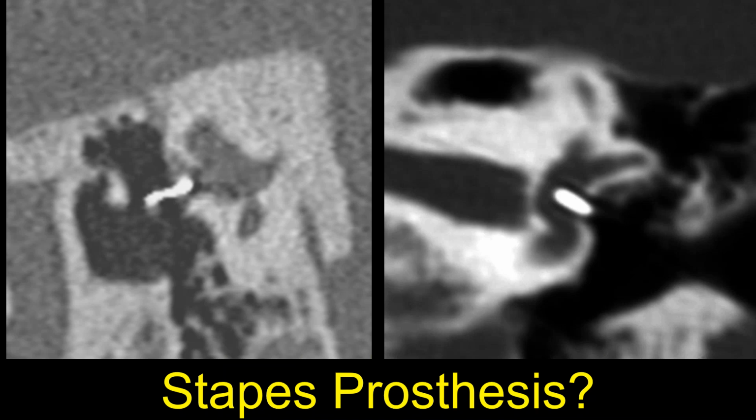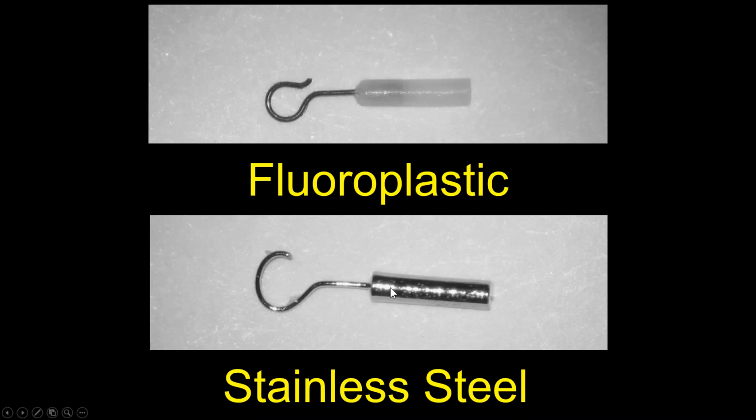So first we took different stapes prostheses. On the top here, we see the fluoroplastic model. So this portion of the shepherd's hook of the stapes prosthesis is plastic. And on this lower model, we see this is stainless steel. So just an example, if you've never seen these prostheses up close, how they look.